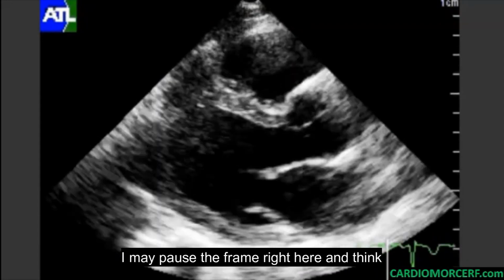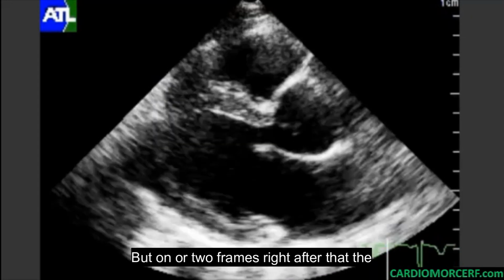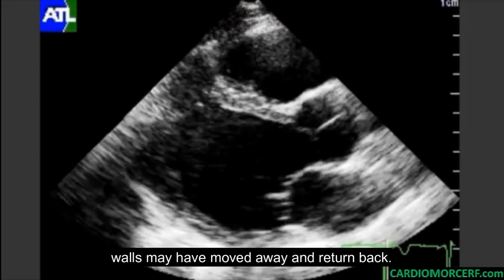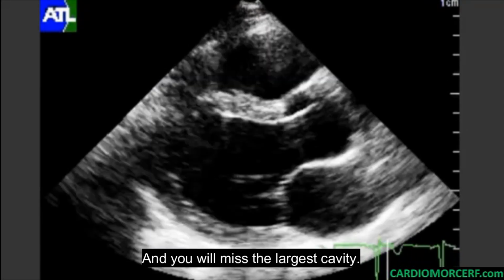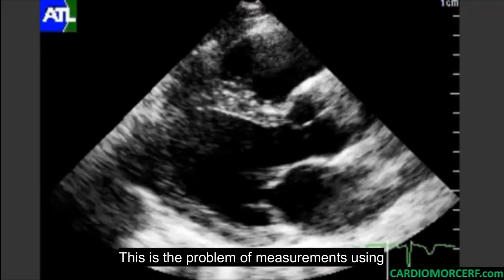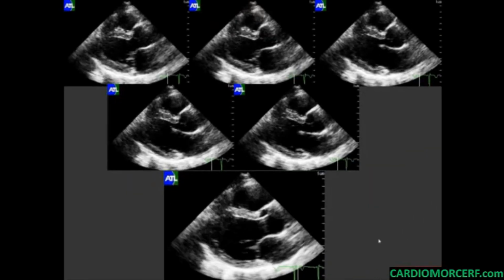I may pause the frame right here and think that this is the largest cavity, but 1 or 2 frames right after that, the walls may have moved away and returned back, and then only seen in the next frame, and you will miss the largest cavity. This is the problem of measurements using 2D of structures that are moving fast.